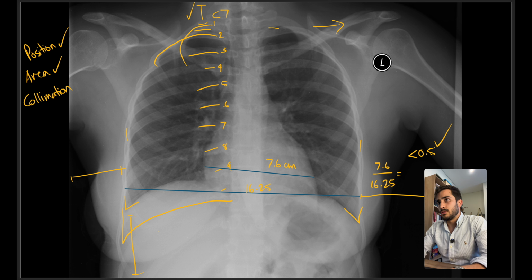And remember, if you recall from your chest x-ray tutorials and lectures, the centering point for a chest, assuming they breathe in adequately, is roughly T7, thoracic vertebra 7, which roughly aligns with the base of the scapula. So the base of the scapula, if it is here, that's roughly the center of the image. Again, assuming that they do a really good breath in, which in this case, it doesn't really look like they have.